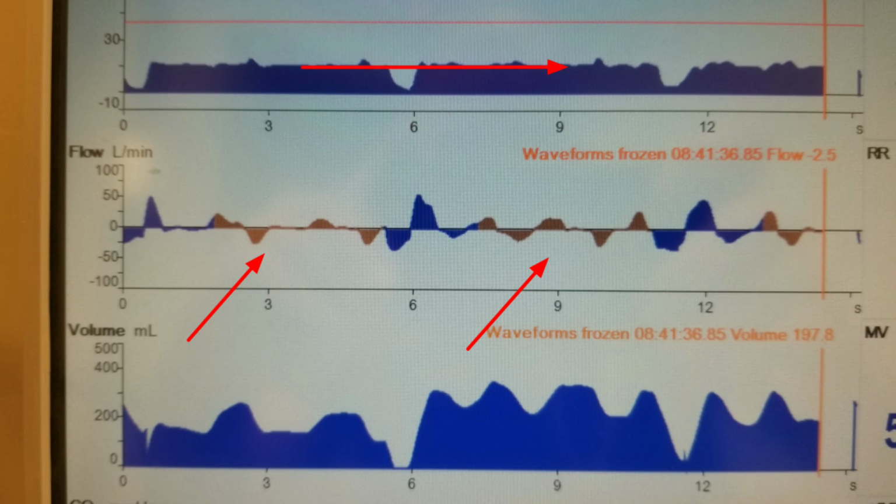Now, this picture above is not ideal. I was trying to create it with just a regular artificial lung, so it does look quite choppy, but it's important to pay attention to the flow time waveforms. It will give you information about possibly being too low with your P high, and vice versa, also possibly too high with it.